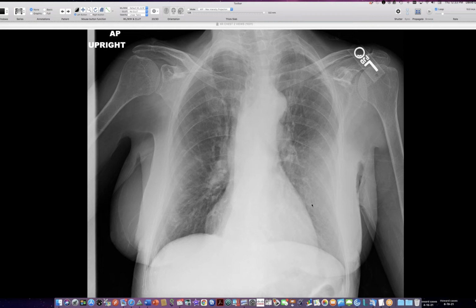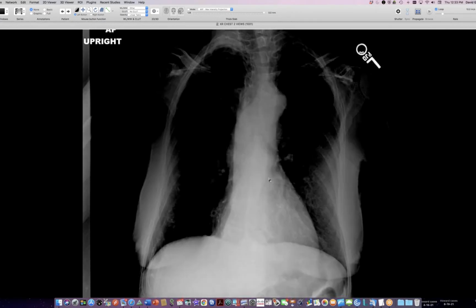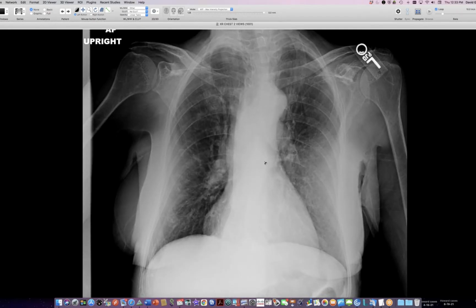I hope people can see a chest radiograph here. There's a slightly strange look to the lower trachea here, just above the carina. You can see it takes a little swing to the left. Funny looking mediastinum a little bit through here.